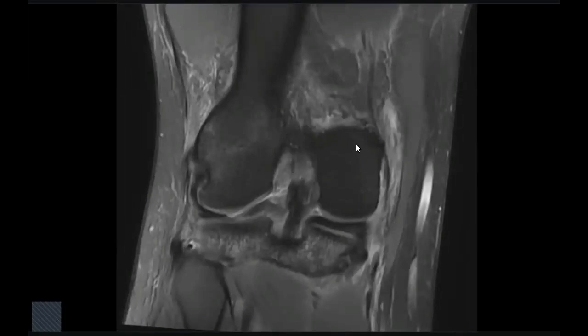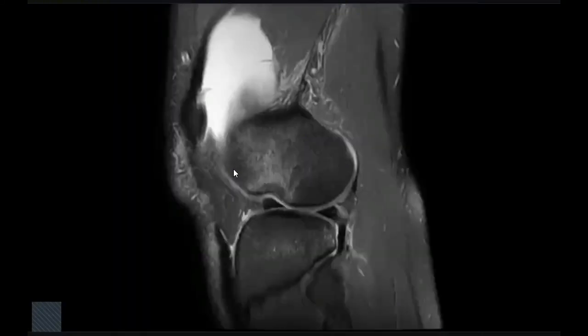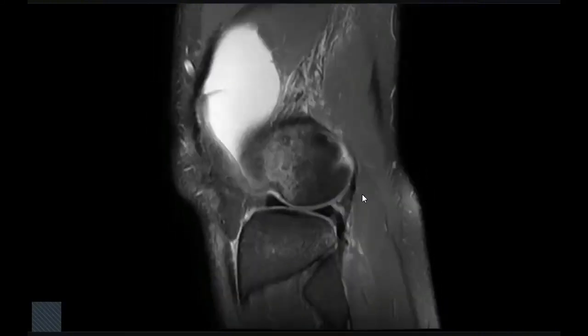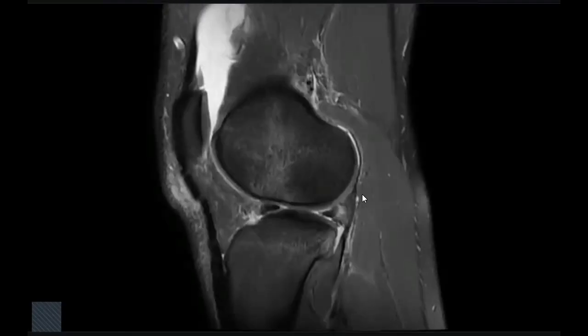So now I would like to check the sagittal PD FATSAT. In the sagittal, I'm checking first the lateral meniscus. The posterior horn and the anterior horn appear normal. While I'm scrolling, this is the suprapatellar region.